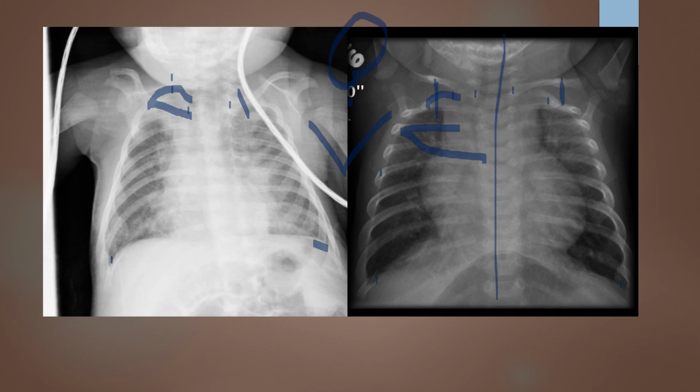Mid-sagittal tilting, they both look relatively well aligned. When it comes down to it, when I had to make the decision, if this one had an adequate exposure index number, I would probably approve this one as acceptable, although I'm not a huge fan of the elevation of these clavicles. I feel like there was a little bit of an angle. That flatness of the ribs kind of supports that.